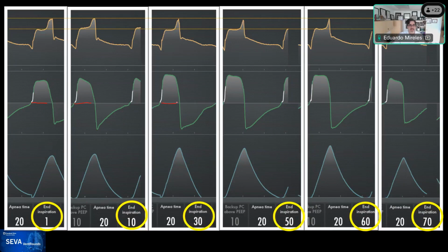So, I mean, actually this is a good point, Roberto. So you would agree that in this patient, at 1%, that is consistent with late cycle, right? Yes, the peak is huge, yes. The effort is long, yes, but there's no ledge to talk about. It's just that the patient relaxes really rapidly. Yep. And so the waveform doesn't look like such. And the only thing that you have is this marker over here. And to get rid of it, I had to go all the way to 60%. So that was probably the closest, but I started touching in between with an early cycle. So probably 50 is the closest that I could get to matching this patient, or 55 perhaps.